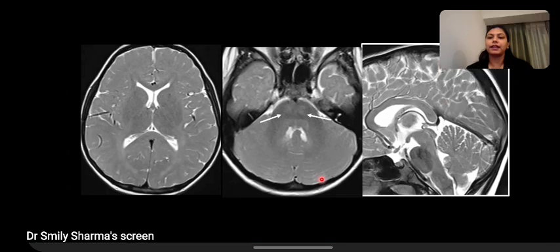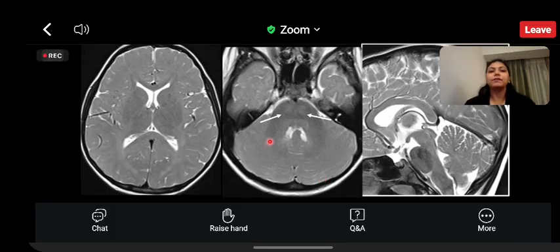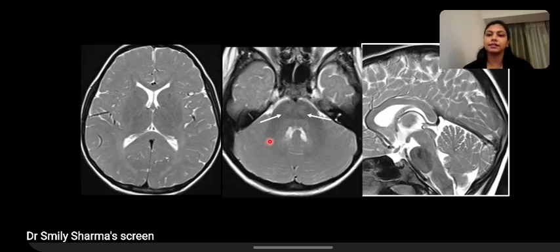yes, so it is PMD. Very good. So we see the involvement of the brainstem except for the ventral brainstem, in which only the corticospinal tract is involved. Then we have the other case where we have diffuse hypomyelination, involvement of both ventral and dorsal brainstem. So this is PMLD. Very good. So now you are answering very quickly. So this is a case of PMLD.